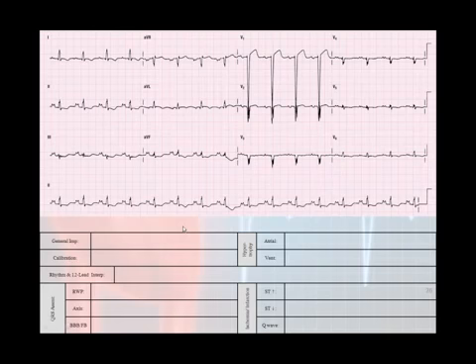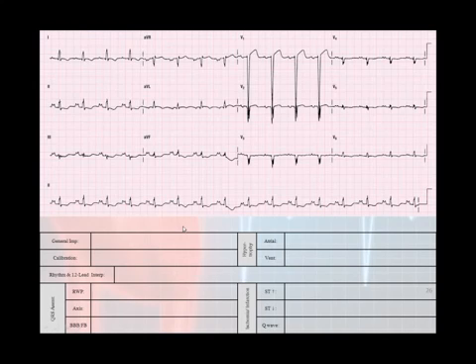Whenever you take a look at this 12-lead, you actually want to ask yourself, do you see anything excessively fast, excessively slow, or ugly morphologies? When you look at the EKG, a quick glance does not really show anything excessively fast or excessively slow. If you're familiar with what a P wave looks like, you can actually say that this P wave here is notched, and that's not normal. But does it look ugly? Not necessarily. So you can put abnormal P wave, or you could just put looks fine or something along those lines.